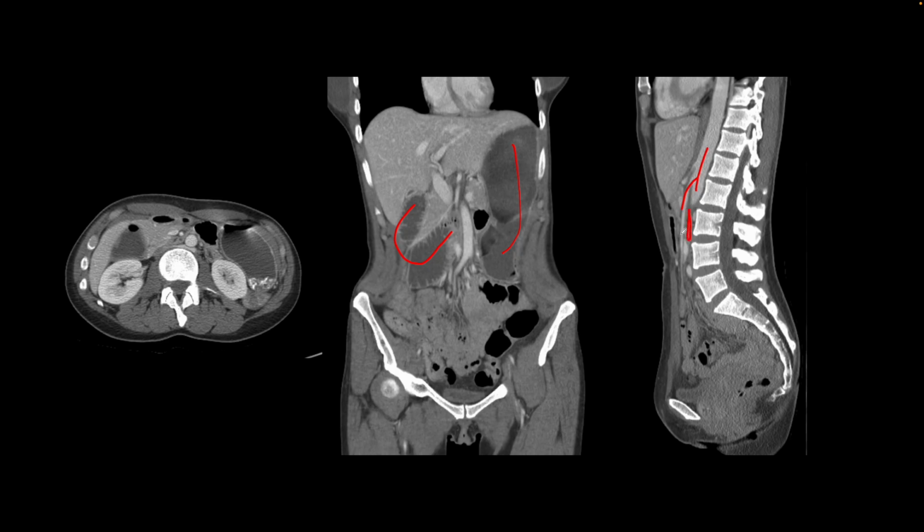as it crosses below the SMA or posterior to the SMA from the right side to the left side, and this is called SMA syndrome, and these patients typically need surgery for their bowel obstruction. Because they've had it for such time, you will find that these patients are generally very slim and they don't have much subcutaneous or intra-abdominal fat.